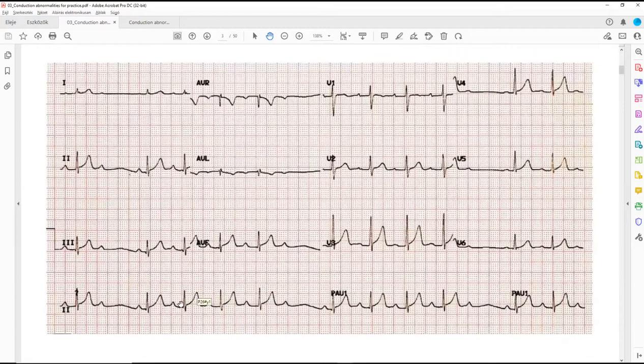And as I previously said, it seems arrhythmic, so I checked the P wave, and since the P wave is positive in lead 2 and negative in aVR, it was proven to be a sinus P wave, so sinus arrhythmia. As for the axis, lead 1 is positive, and aVF is also positive, so it is within the normal range of 0 to 90 degrees.